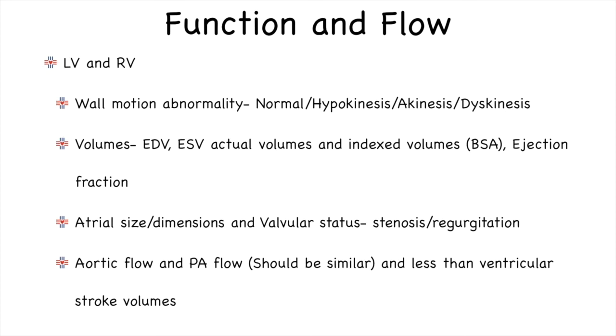So I would say hypokinesis in mid and apical anterior, mid anteroseptal, and apical septal segments rather than saying mid anterior hypokinetic, mid anteroseptal hypokinetic, apical anterior segment hypokinetic. This kind of makes my report more concise and easier to interpret.